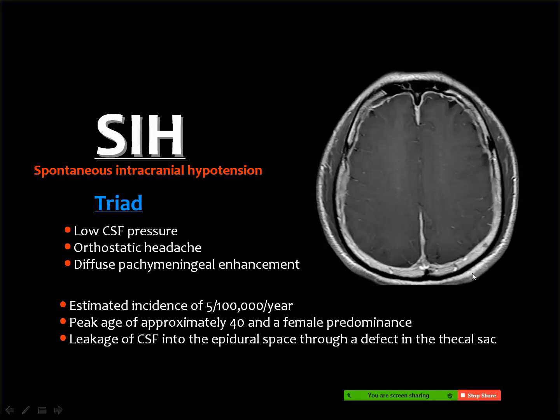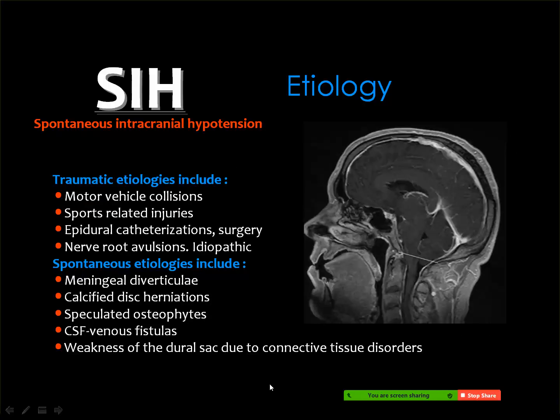Of course, you can consider this as meningitis, as sarcoid, as leptomeningeal carcinomatosis sometimes, but the history is very important for the diagnosis of spontaneous intracranial hypotension.